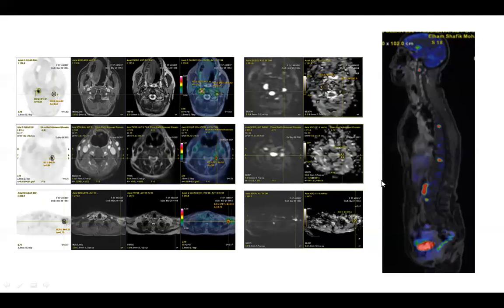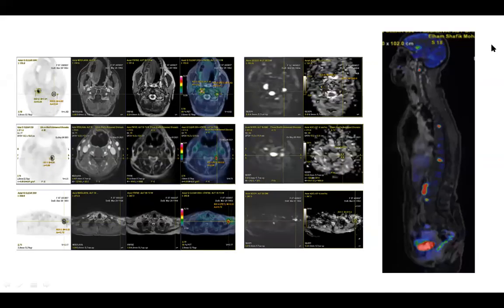These images show the variable involvement of the vertebrae, starting with C2, together with dorsal and lumbar vertebral involvement. This case was furtherly, or histopathologically, proven to be a lymphoma with a heavy osseous involvement rather than nodal and soft tissue involvement.